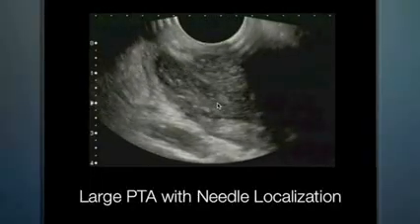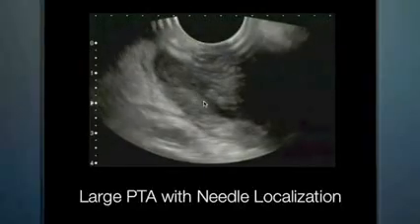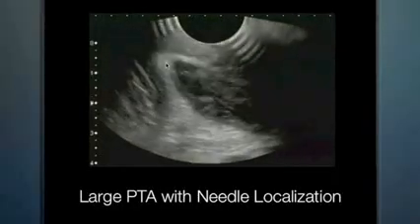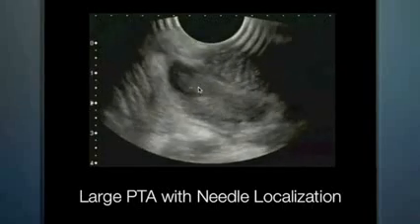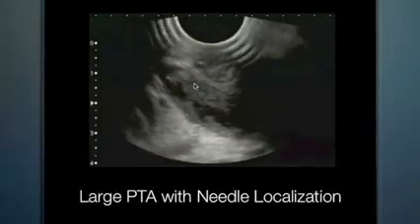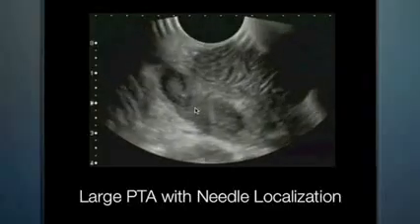With this very severe degree of a peritonsillar abscess, you may find that some of these are so large that they're very easy to drain, or that they're so extensive that they may need to be drained in the operating room for maximum comfort and securing of the airway. However, ultrasound does help to differentiate how difficult or easy a drainage procedure could be.